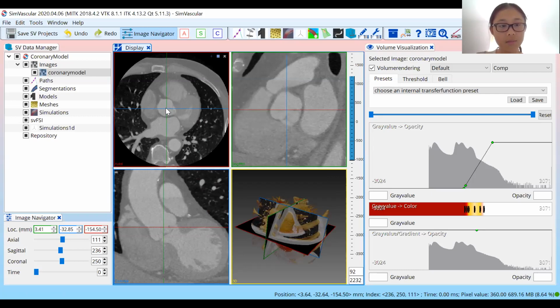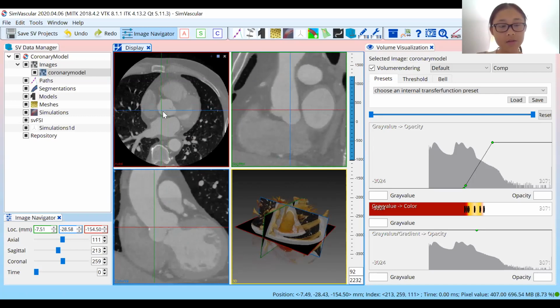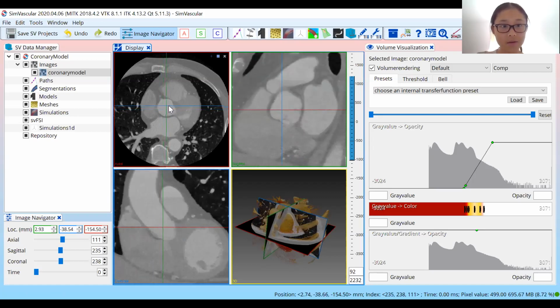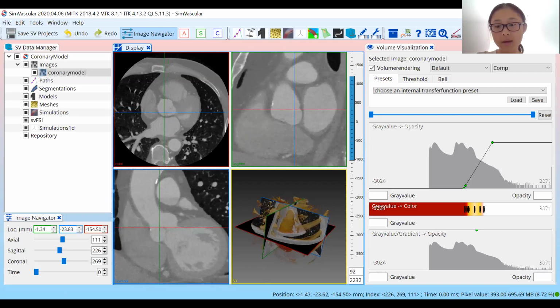We'll use our mouse or cursor and drag it around to determine what the pixels are at a particular vessel. So here, what I'm doing right now is just showing the aorta, and since the aorta is quite large, it is pretty easy to identify. So if I just mouse over the aorta here, we can do that while looking at the pixel value on the bottom right corner of our screen.